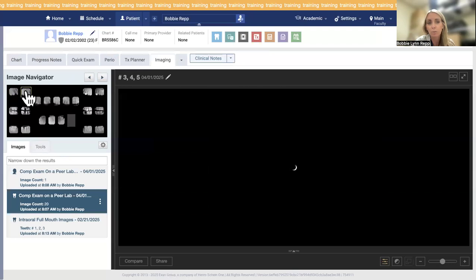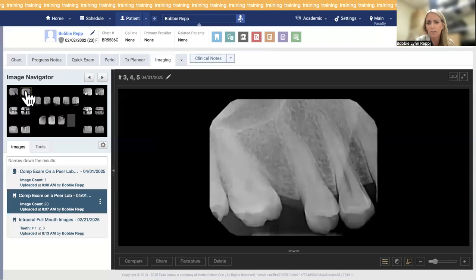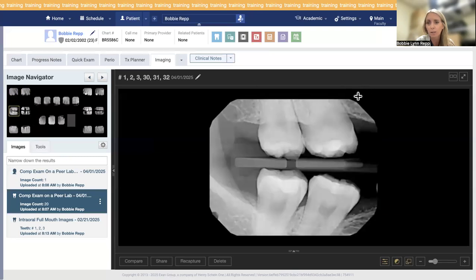So I'm going to use the PAs to look, but it's kind of hard to tell. So now I'm going to jump down to my bite wings. Sorry, I've got to move my toolbar, which I don't think you're seeing, out of the way so I can see better. Here, it's kind of questionable. There might be an occlusal composite here on tooth number 2. If you remember, this was the third molar, second molar.